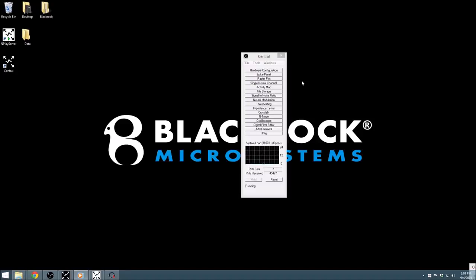This video series covers the basics of working with our Central software suite. If you don't have Central up and running yet, you may want to check out our Getting Started video for more information. This tutorial covers file storage. The file storage application within Central is used to save recorded data to the local computer. While it has a relatively simple user interface, this tutorial will cover all of the options available.